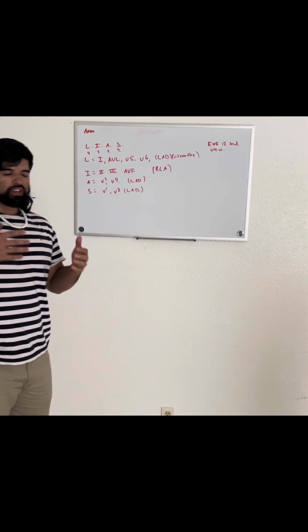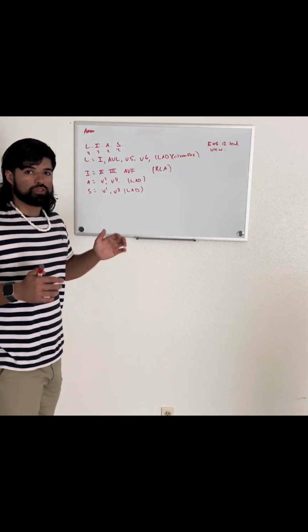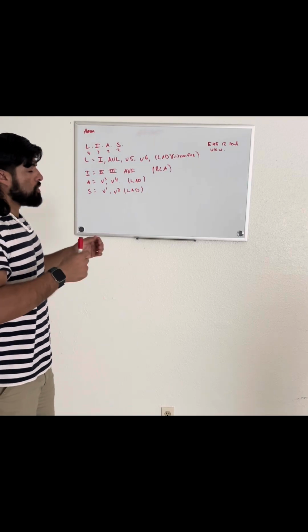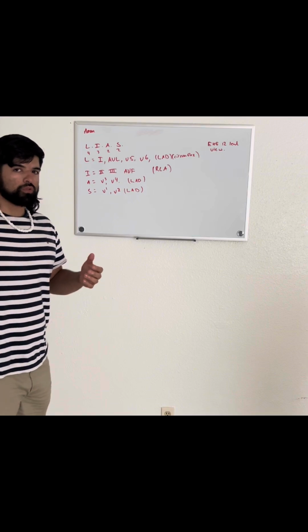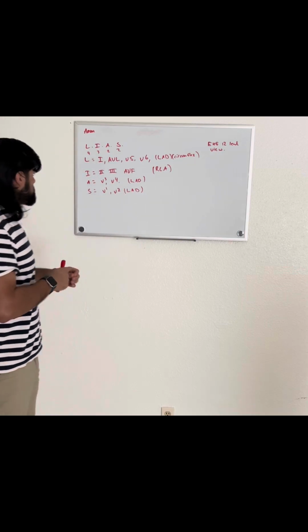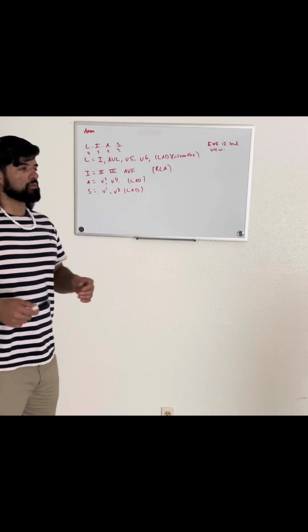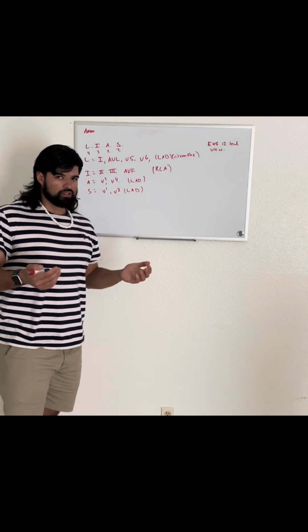So when we're looking at a 12 lead EKG, there are going to be 4 views you're going to be looking at, which is very important to know, what direction, since it's a 12 lead and there are 12 views with 10 electrodes attached. Are we going to be looking at the lateral, the inferior view, the anterior view, or the septal? And then we're going to explain the coronary arteries attached to each one.